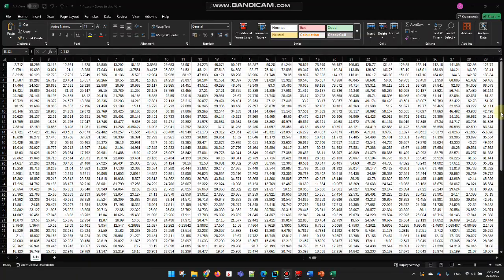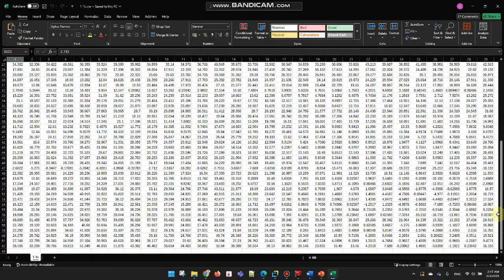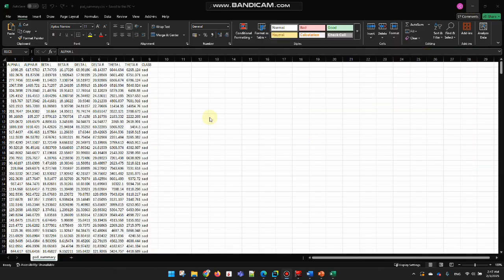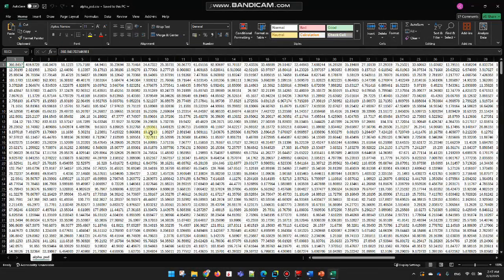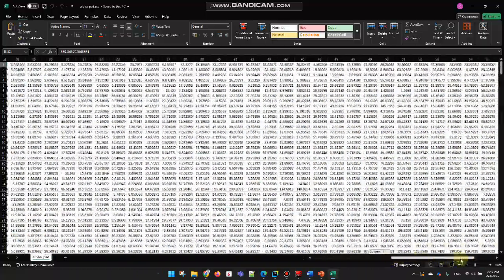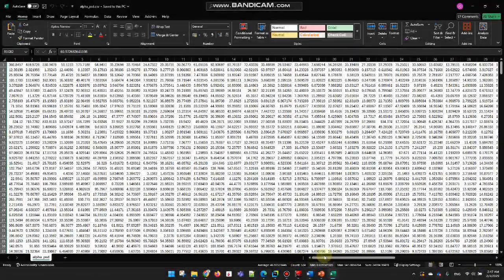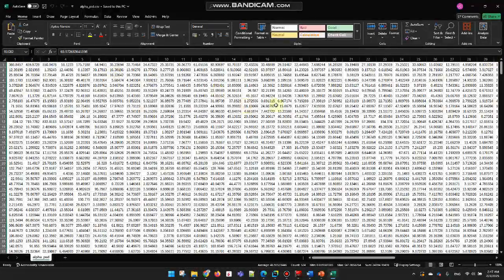This is the original dataset. There are 62 rows for 62 channels and multiple columns for many samples. This file will be processed to produce the band PSD CSV. So this CSV should contain 62 columns for 62 channels and multiple rows for the multiple data frames.